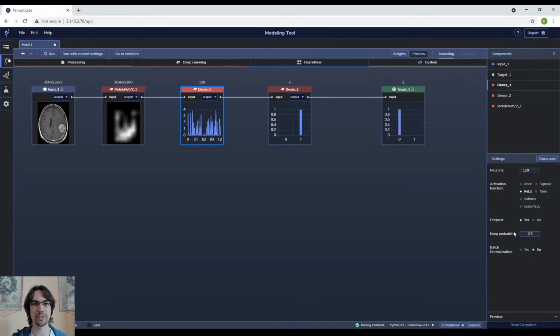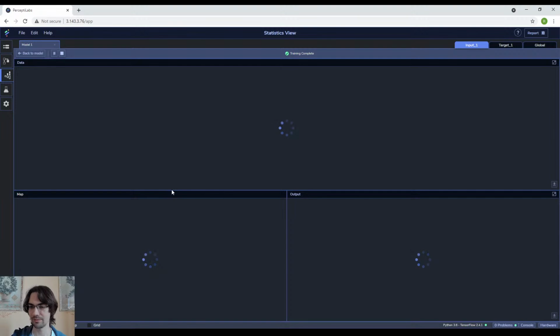There are a few different ways to imagine what this does. You can look at it as creating a lot of different models and then averaging them. The important part is that the different models are smaller than the original model, which means it's less prone to overfit. It's less complex. It's not going to hug the data points as tightly as a more complex model, and it may therefore perform a bit better. So let's try that and see what happens.